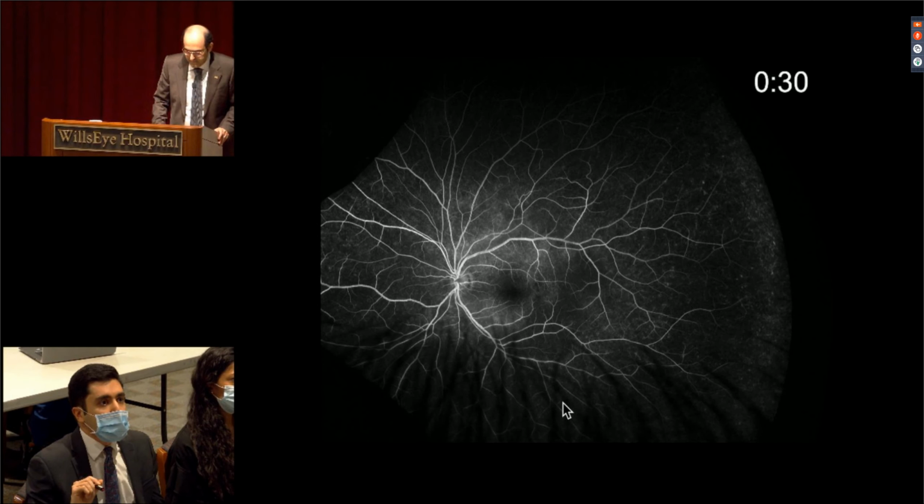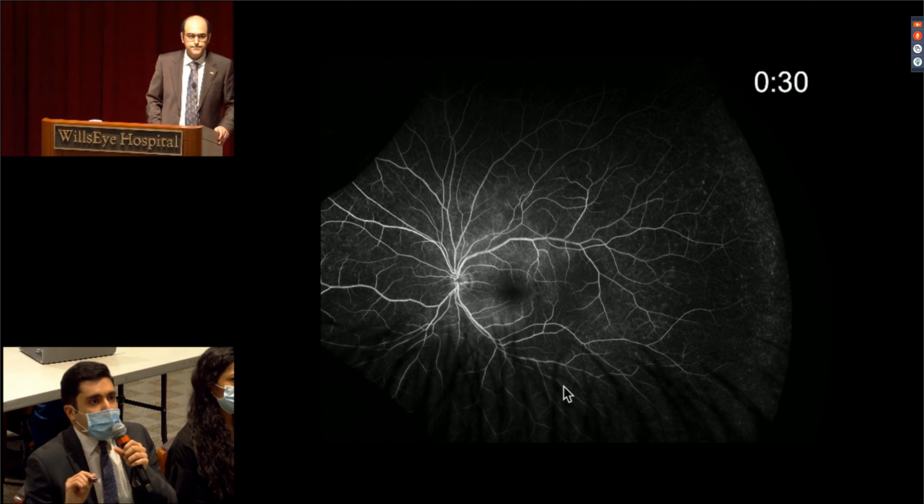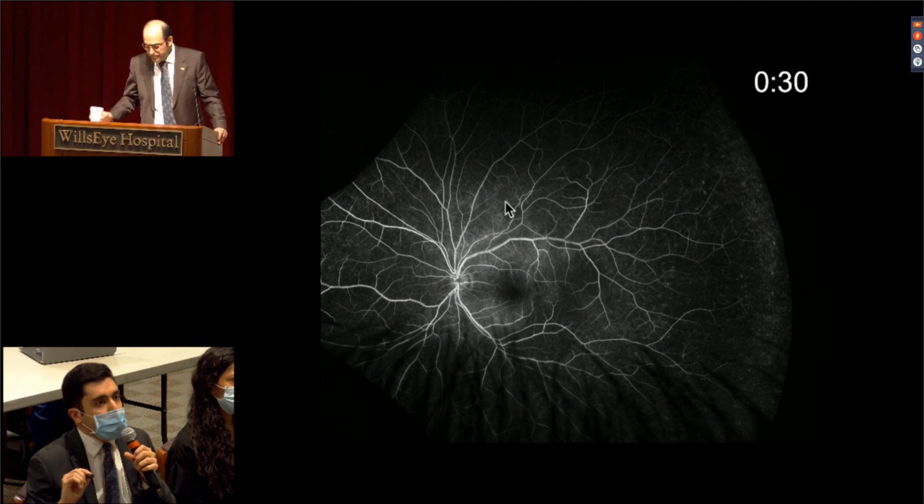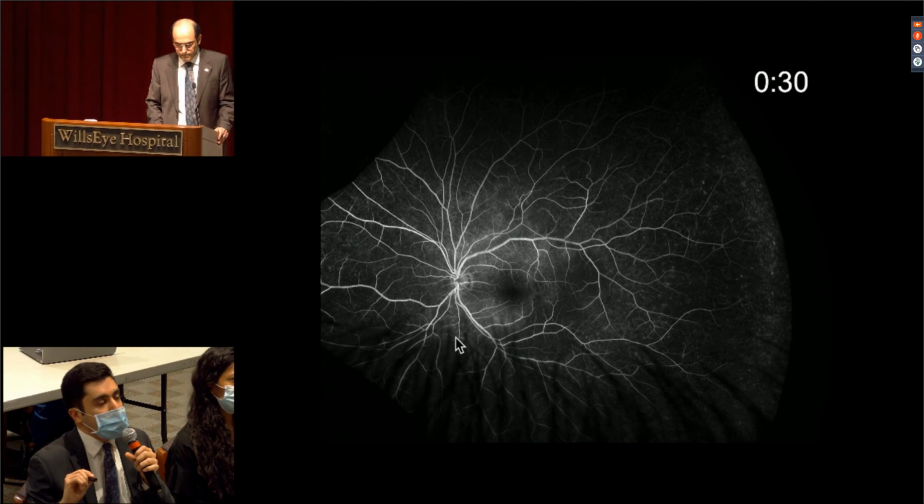Excellent. And then the same imaging modality, this time the left, I'm assuming the transit was on this side. We have an earlier frame at this point. We can see the laminar flow in the veins at this point in time, which is appropriate. And then once again, we're seeing this hyperfluorescent pattern corresponding to the areas of change we were noting previously. So mostly central macula, but it does extend beyond the arcades superiorly and also inferiorly. And a hint of those speckled changes we were seeing in the temporal periphery, even nasally early on as well.